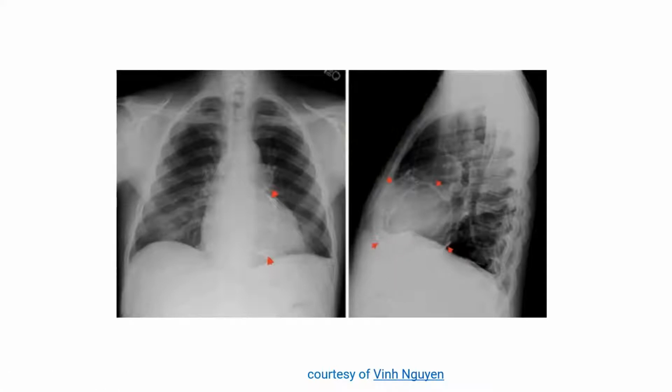Okay. Mainly the left ventricle. Okay. And what else? Calcification. Yeah. There is calcification around the heart body. Yes. Right, Ahmed. That is calcification.